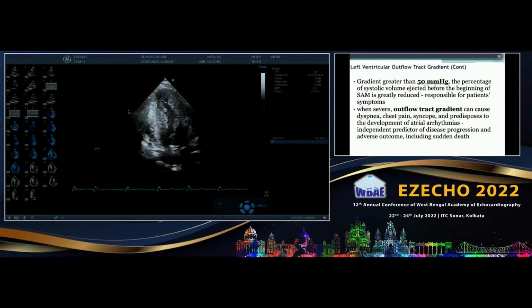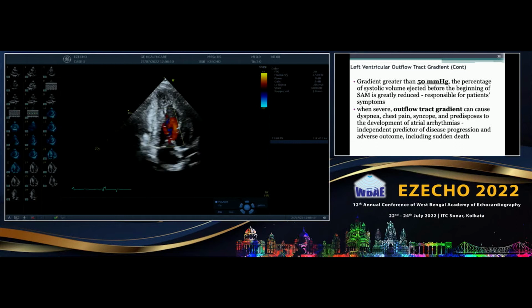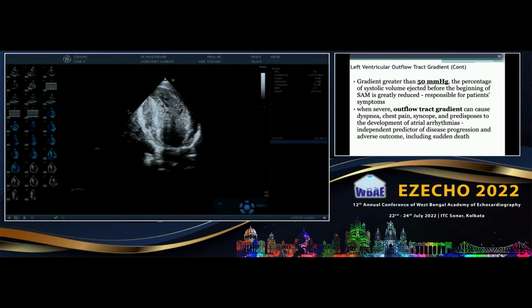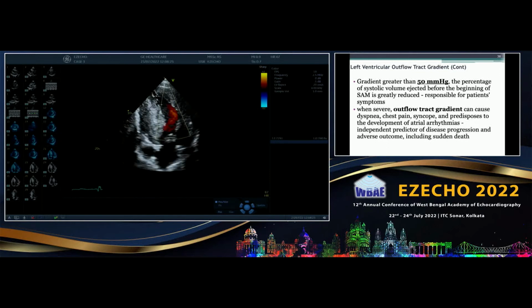The pointers that give you a suspicion that there might be some aneurysm: generally, if you put a color Doppler and you have turbulence in the mid cavity, that is why the mid-cavity is so important to look for. So Nitin, generally, there is a suggestion. One is that, as everybody was telling, if there is a mid-cavity obstruction, there is a definite chance of an apical aneurysm. And another is putting a Doppler and getting a Nakamura sign, where you can get the mid cavity.